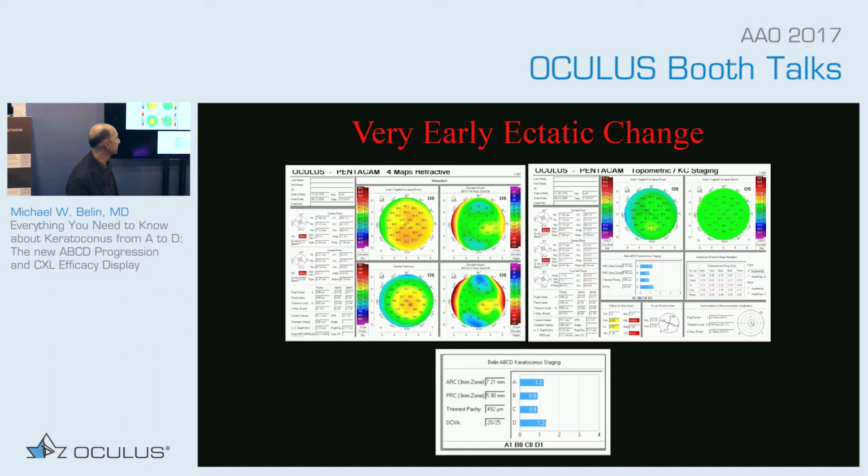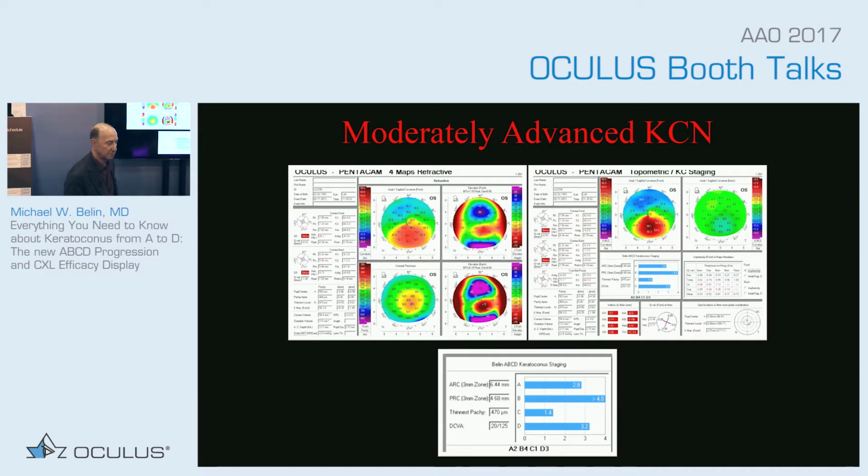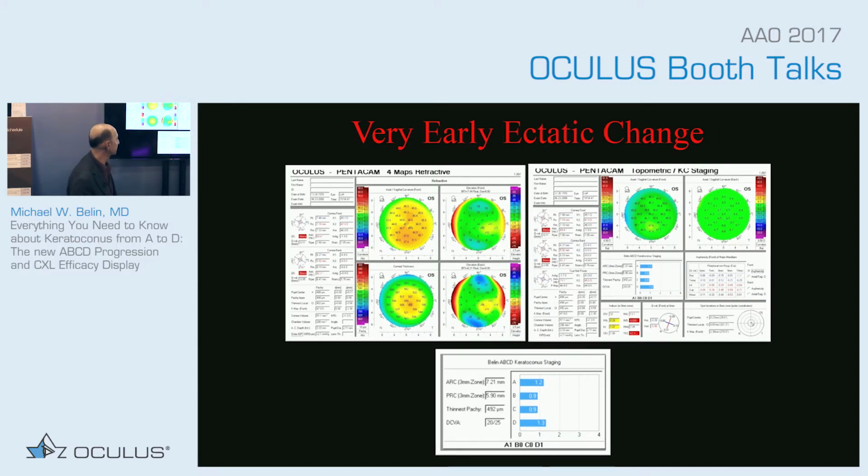That's correct. So is the BAD high or normal in this? That would be abnormal. I don't have that on here. It would show up with a red box on the final D. It may be a yellow box. I would have to look at it. But that would show up as abnormal, yeah.